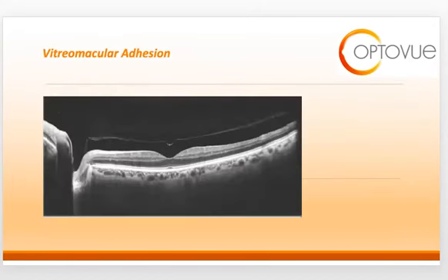This is really the second stage of a vitreomacular adhesion, or the second stage of PVD development. You can see here that the vitreous has detached from the macula.